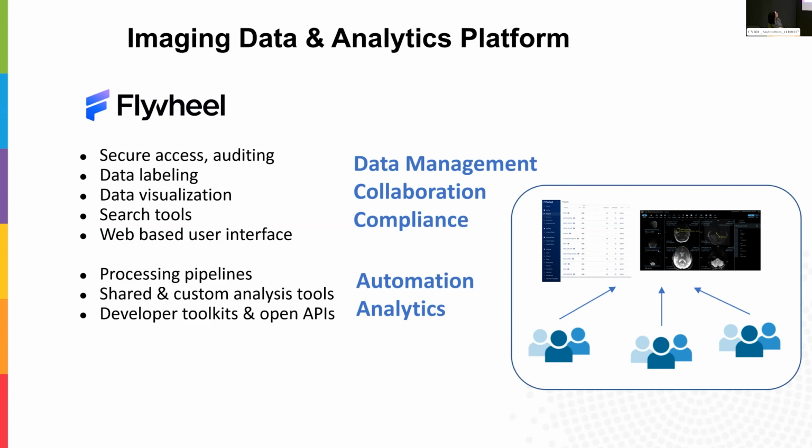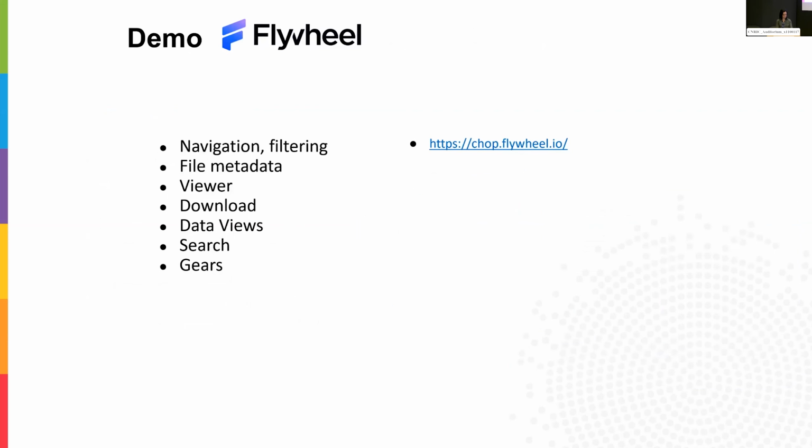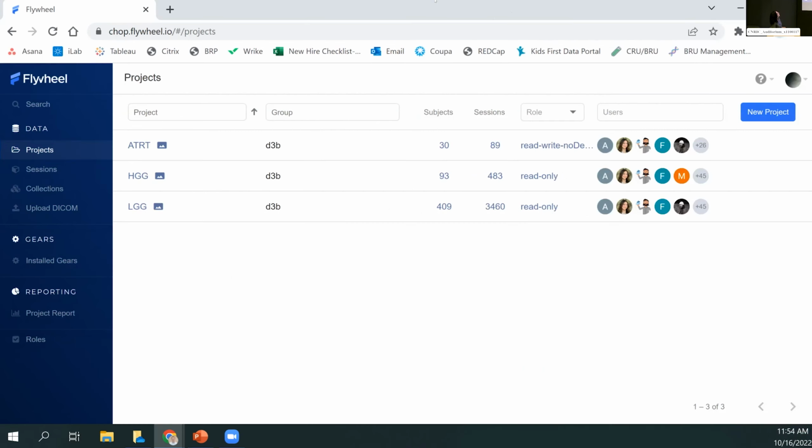All right, let's hope this works. All right, so here what I'm showing you is I've just logged into a sample user, and to log in essentially just requires a Gmail address. Once people have been granted access to a given data set, they would see that on their landing page here. So you can see each of the different data sets I've been granted access to and high level project or data set information.